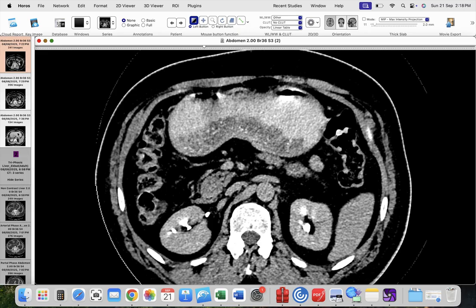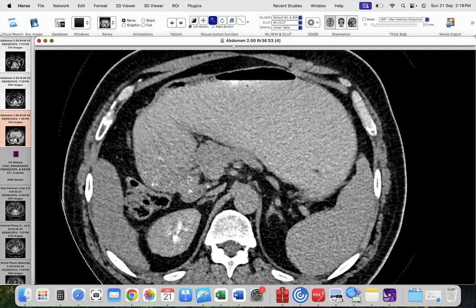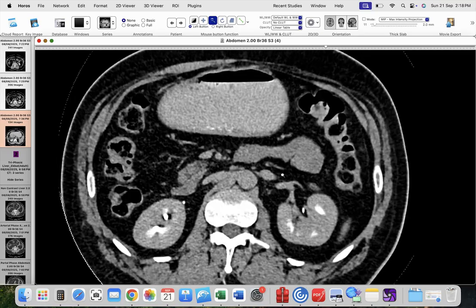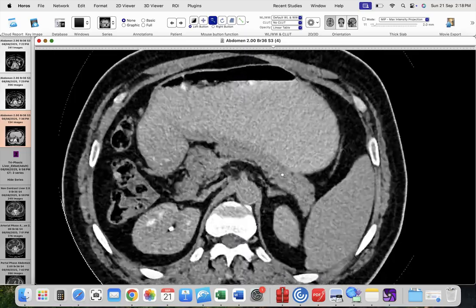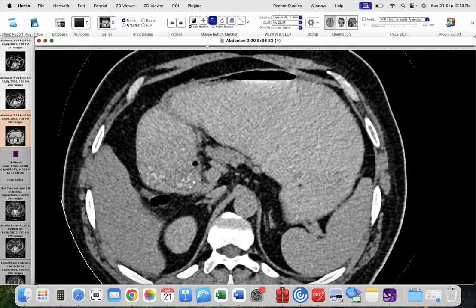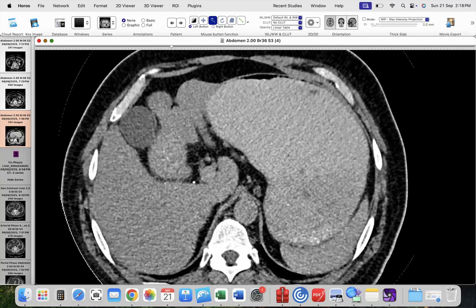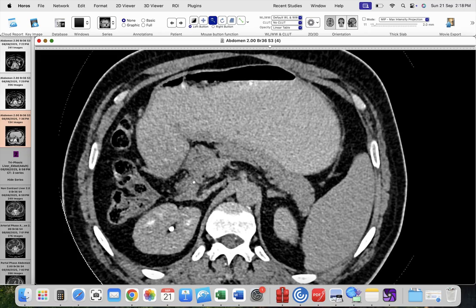After 15 minutes, we repeated the imaging of the stomach to assess any passage of contrast, which confirmed that there is a true luminal compromise at the gastric outlet, mostly sequel to a stricture, because we don't see a mural thickening or a mural soft tissue lesion.